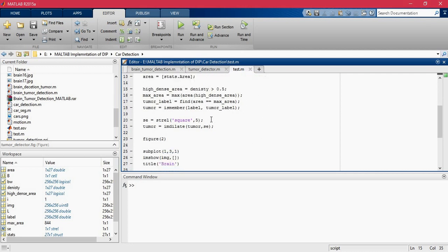And now we're going to use a morphological operation, which is dilation, a very basic morphological operation, just to make sure the tumor is filled with the same value, like white, 1, because sometimes you can detect tumors and see small pixels inside the white group of pixels.